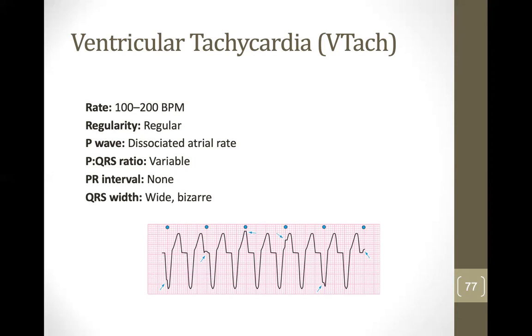When we start taking a look at the actual contraction of the contractile cells, we'll explain why this is happening and why it takes so long that it actually is this wide QRS. But they kind of look bizarre, right? Some people talk about that they look like tombstones, which means that they're very quickly leading towards death. So when we have ventricular tachycardia, this is not a healthy rhythm at all. They are on their way towards cardiac arrest.